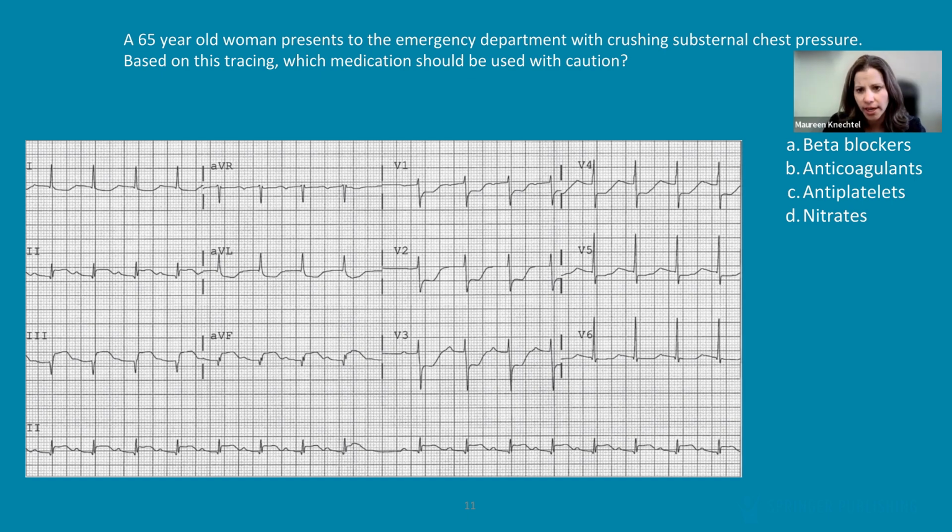And if we think about the coronary anatomy, everybody is either right or left dominant. So your posterior wall of the heart is supplied by either the right coronary or the left circumflex. So you can also see posterior involvement with left circumflex lesions. So you should always look for that. And if we see that, it just tells you about the potential extent of ischemic involvement.